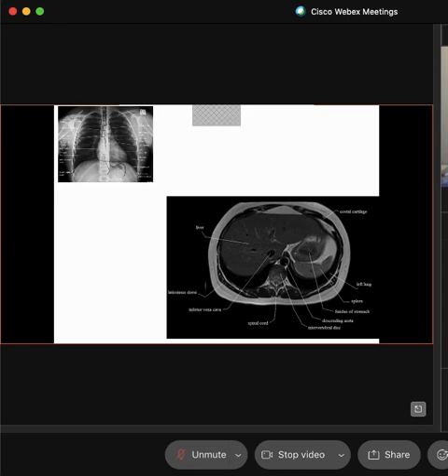I'm lost right now. Axial. Well, I want you to pay attention to this, Daniel. Here is the spinal cord. Look at your information. So this is the back. Then this has to be the front.